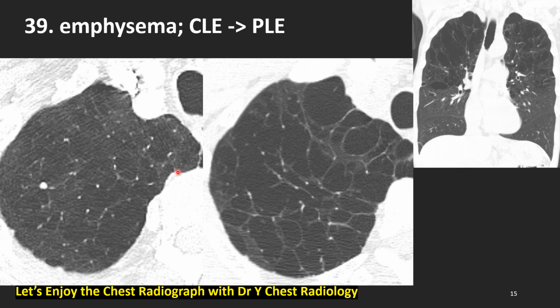Emphysema, one of the forms of COPD. This left side CT, thin section lung window setting CT, shows severe form of centrilobular emphysema. Centrilobular emphysema. This peripheral portion is looking normal. This portion shows normal, but other areas show centrilobular emphysema of severe form.